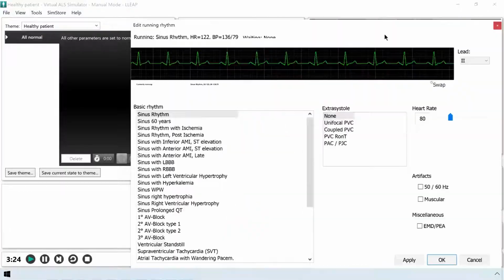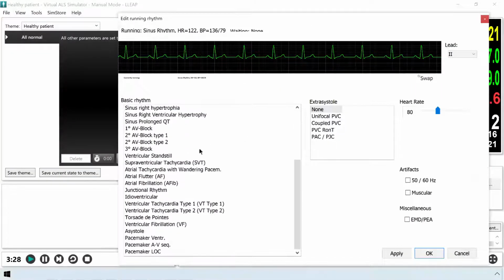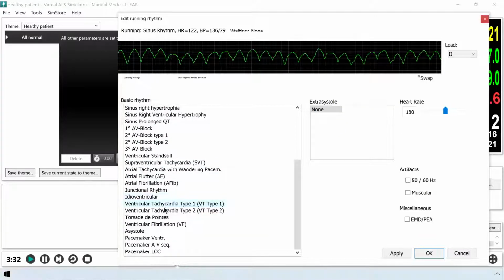Let's go ahead and change the heart rhythm because not everybody's healthy, and I want a patient that's just death. So you click on the rhythm, and you can edit by clicking through all these different things through here. Yay, we can see ones that look pretty. That one looks kind of cool, but we can't do anything extra with it. And then we can do other things too.